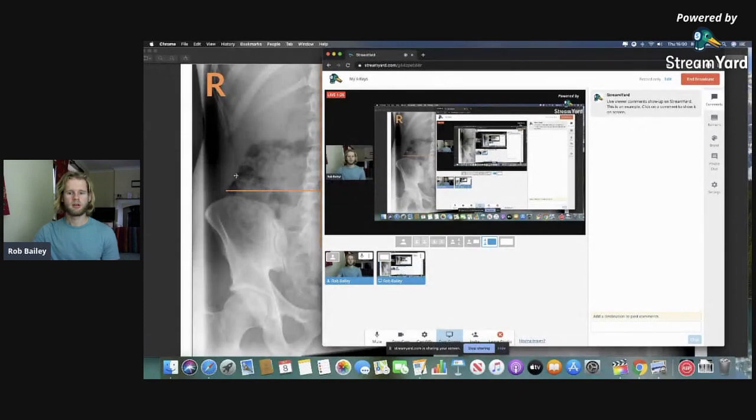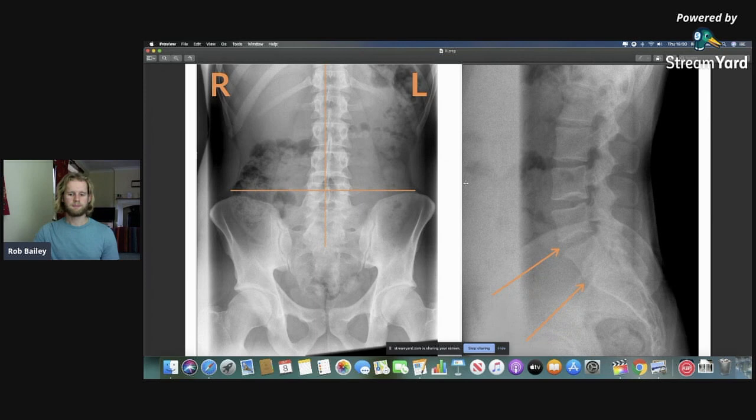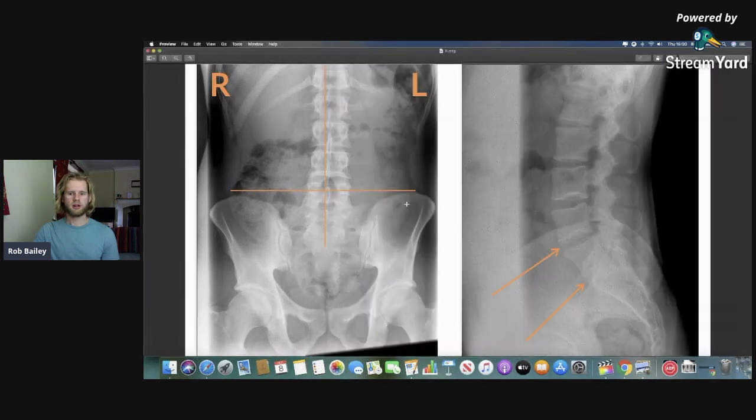So what we're going to do now, I'm going to share my screen with you. I'm going to walk you through my x-rays, and you can see those, and I'll explain to you what they all mean. Okay, so there we go. So what we're looking at here, this image is where you're looking straight at me and I'm looking straight at you. So this is what we call an A to P, an anterior to posterior, front to back.